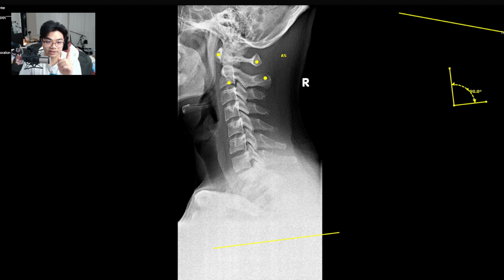So first we're looking at the lateral view of the x-rays, because the only way you can determine the first of four letters of the atlas listing is from the lateral view. The first letter is always anterior, and the only reason for that is because behind the anterior arch of the atlas is the odontoid process. Because of that structure, it's not possible for the atlas to go posterior. So we always assume if there's an atlas listing that it's always anterior.